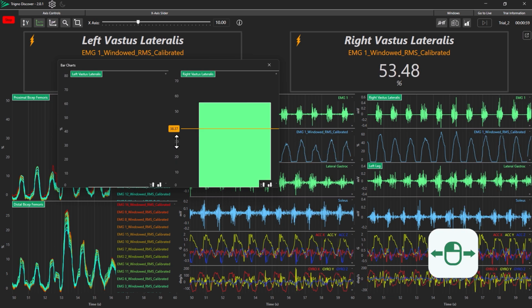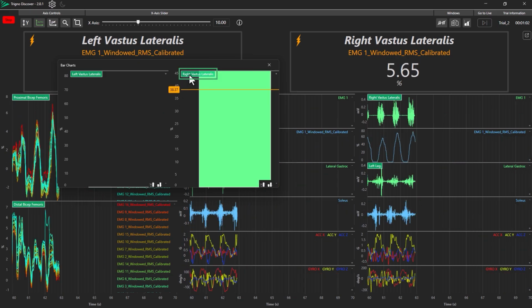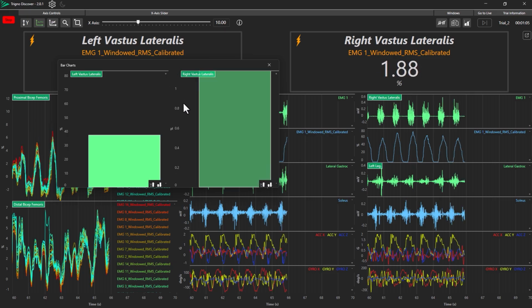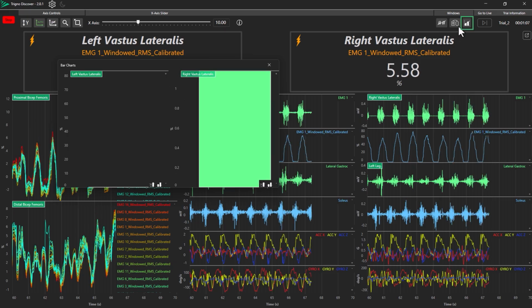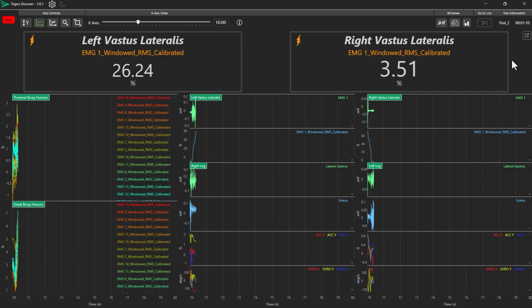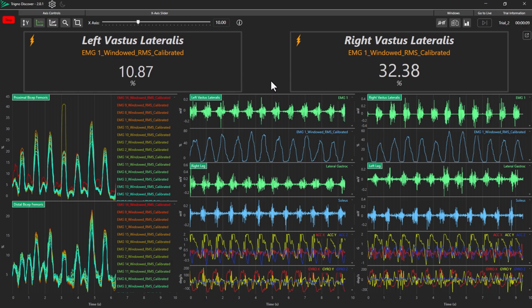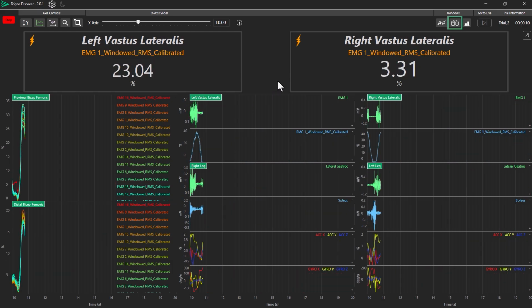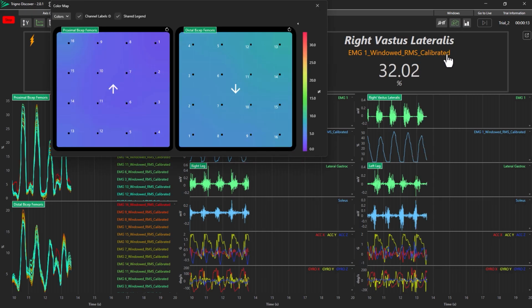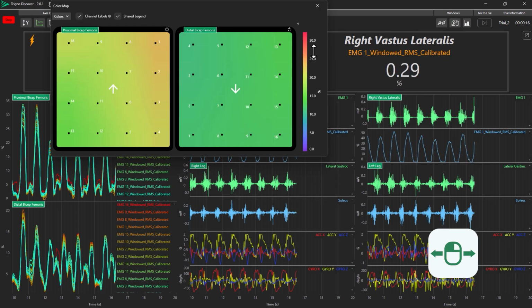The Y-axis of the bar chart can be scaled by clicking and dragging the Y-axis. Double-clicking the sensor name in the top left corner of the bar chart window will reset the Y-axis scale. To close the bar chart, select the same Close Bar Chart icon. During a data collection, the colour map can be made visible through the Open Colour Map icon under the Windows section. The Y-axis scale can be altered by clicking and dragging the Y-axis.